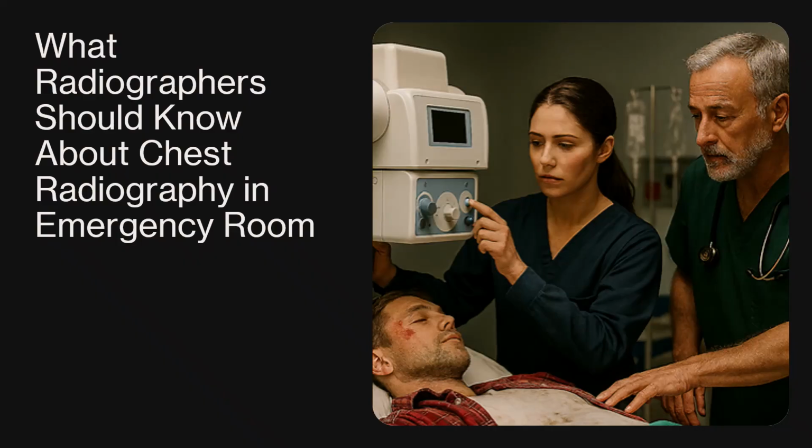Radiographers don't diagnose, but they play a frontline role in trauma care by producing a preliminary evaluation of images that may contain life-threatening findings. Their job is to recognize and not interpret, and to know what to look for, flag abnormalities, and ensure the image quality supports accurate diagnosis by the radiologist or the trauma team.